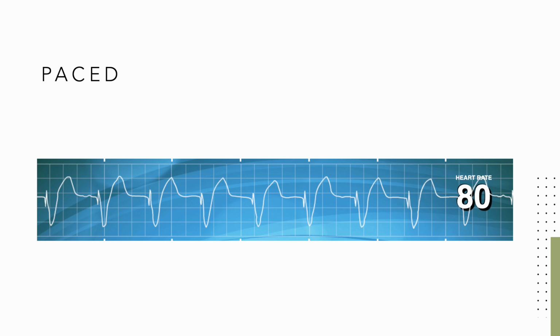Just like our last rhythm with the atria being paced, this rhythm shows a pacer spike before a QRS complex. This QRS complex is wide and kind of bizarre looking. This is a ventricularly paced rhythm. The pacemaker is keeping the ventricles moving. Notice how on the rise up on the T wave, there can be some ST elevation. This is a teaser for next lecture when I talk about something called Sgarbossa's criteria.